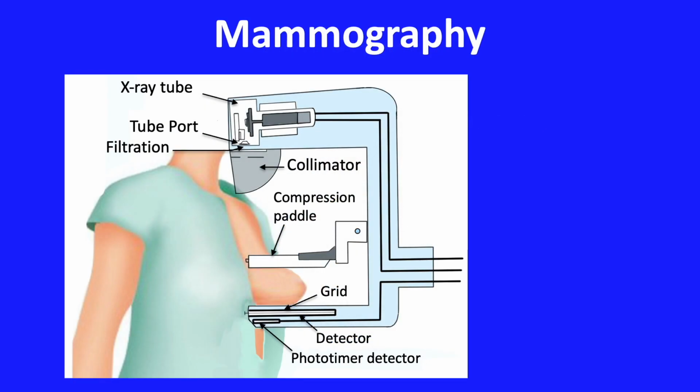The primary imaging modality for examining the breast is mammography, a radiological procedure that is optimized for the evaluation of breast tissue. A mammography unit is designed to confine a remarkably minimal radiation exposure to a single breast, which is somewhat flattened by compression paddles. You can stop the movie if you wish to look more closely at the different components of the machine.